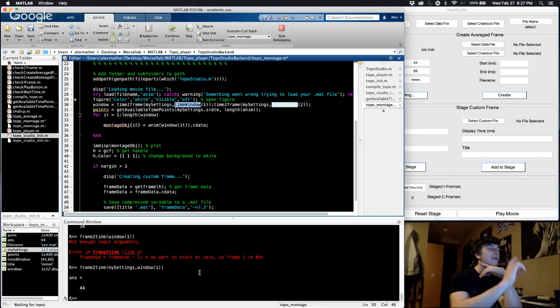And if they're not, what are the closest things to them? Then we want to display in the command window that we found something you didn't necessarily ask for, but this is the closest thing.